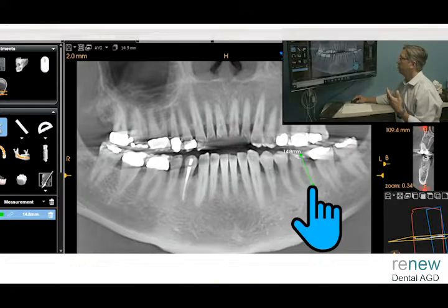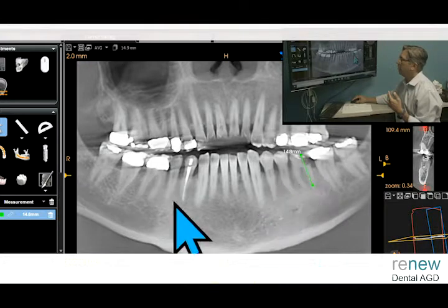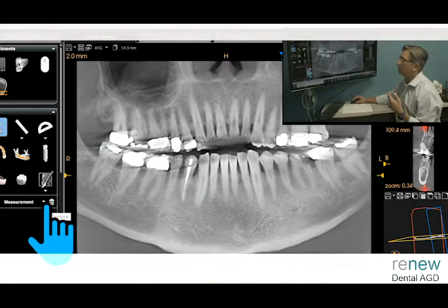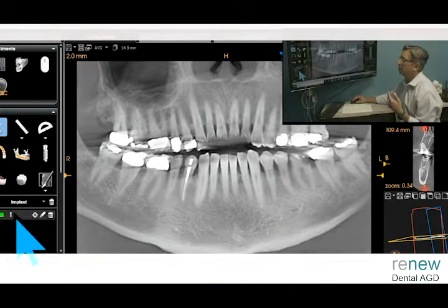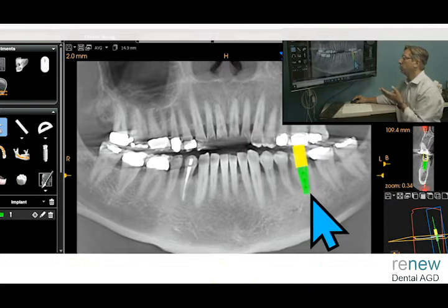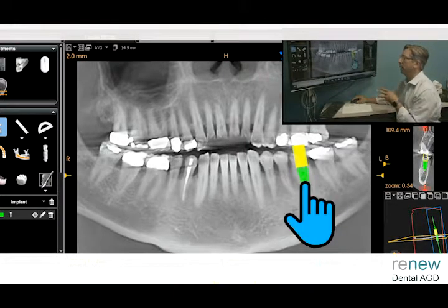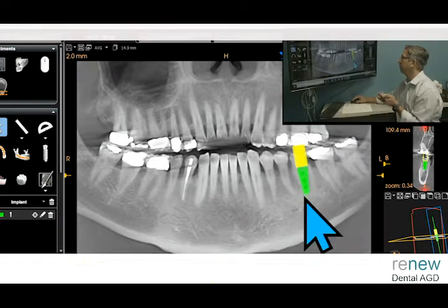So you're stuck with soft bone, hard bone, soft bone. Okay, so if you clip that away, everything is soft bone. So now when you think about having soft bone and you put the implant in, you actually have an area where you don't have any resistance, and it doesn't force you into the area that you don't want to be, which is the front or the back side of that particular socket site.